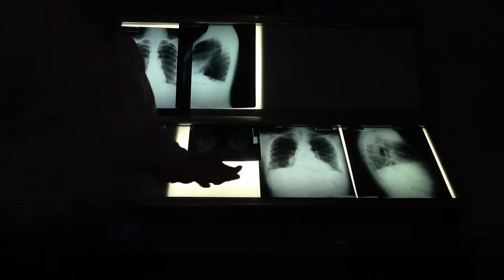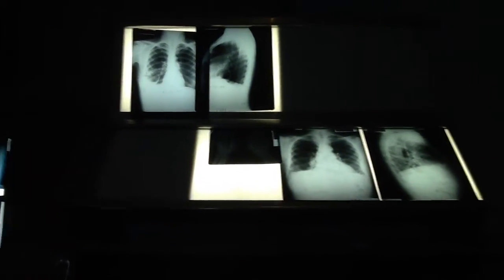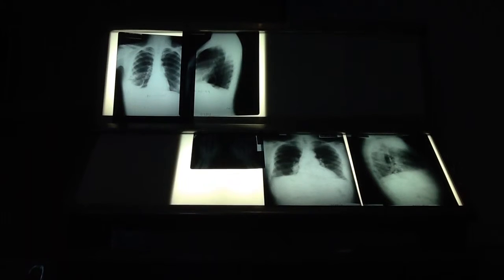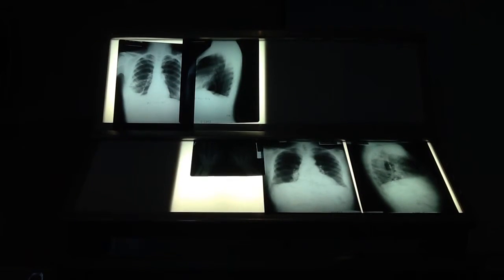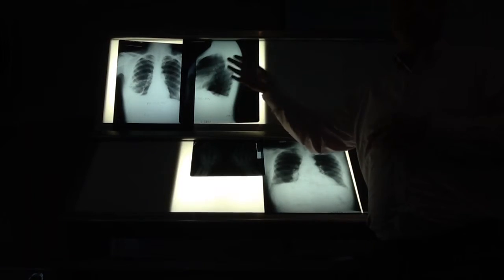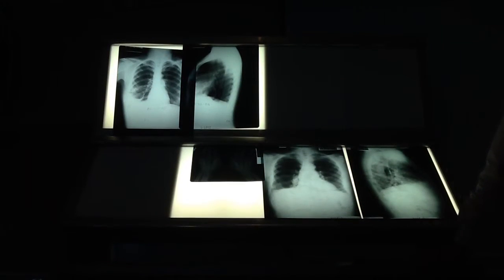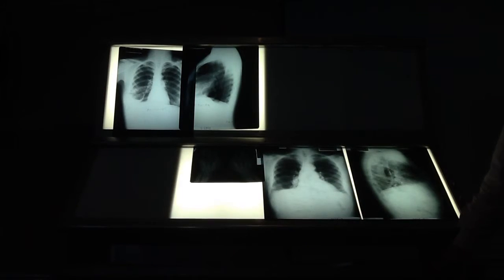Fluid levels are more common when there are tumors or infections, okay? But a cavitation is a cavitation. We've talked about that all quarter long. Now, one thing that is pretty good here is this one is thin-walled, right? And it's very regular, okay? So it's telling us it's more toward that benign side, okay? And the very last thing that I posted on there are the two drawings of the different patterns of cavitation.